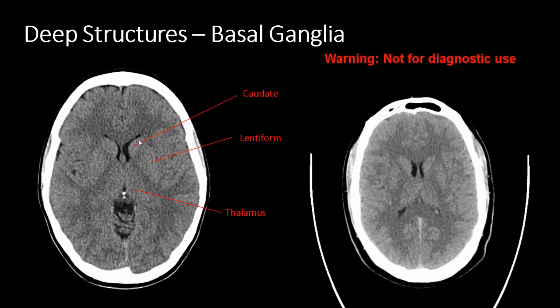We can see, well, they're deep in the brain. They're more dense than white matter. And again, how do I know that? It's brighter than the white matter. It's more the attenuation of the gray matter, which is this brighter outer ribbon. So we know there are gray matter structures which are deep in the brain.